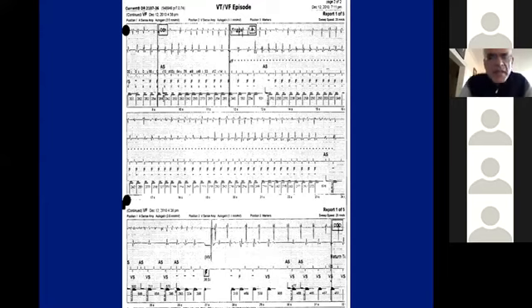So let's go over this together. We know the patient is in atrial fibrillation. Then all of a sudden it accelerates to a faster rate. This is again, these electrograms come from a lot of places. You don't always know the clinical scenario. But this is so fast that most likely this is ventricular fibrillation.